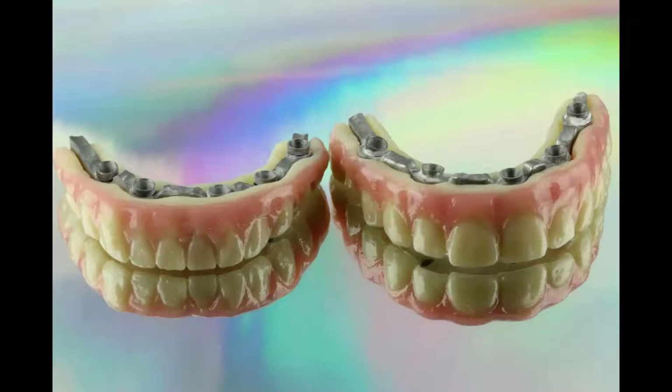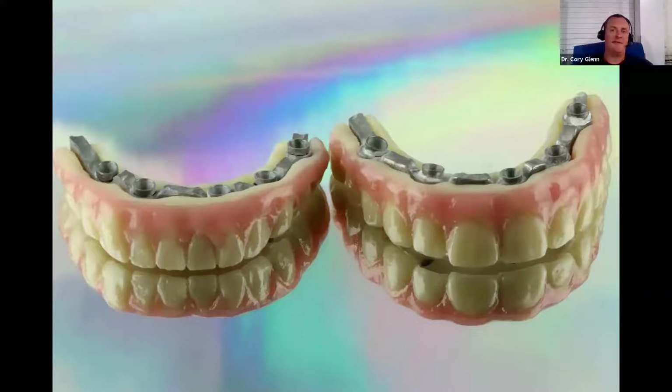With your Form 3B, have you had any problems with adherence to the build plate if trying to print a single crown or a similar small object? I have not run into it. I've done a lot of single crowns on there, and thus far it's not been an issue. They tend to pop off.